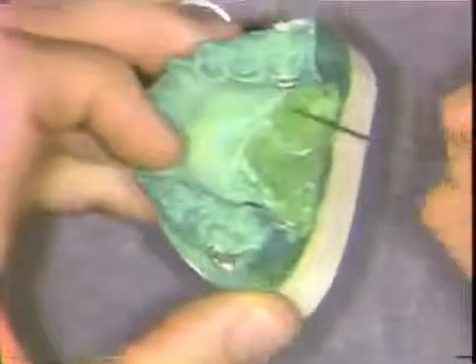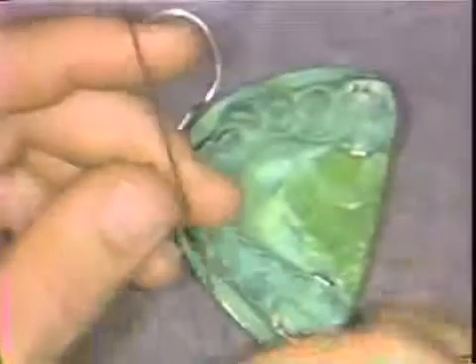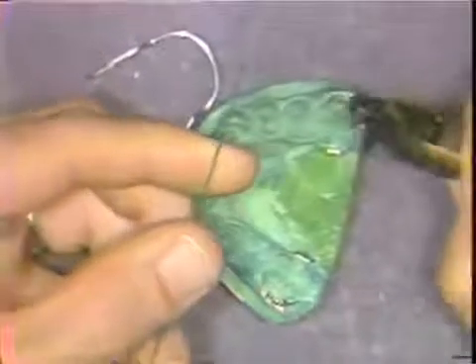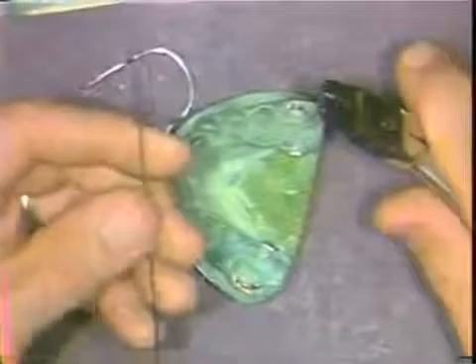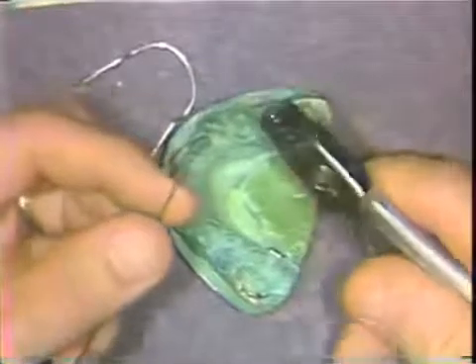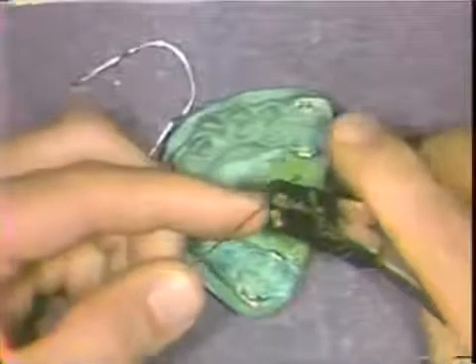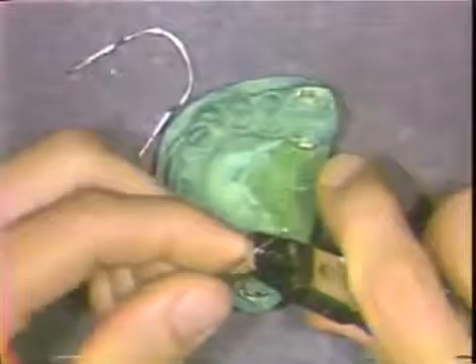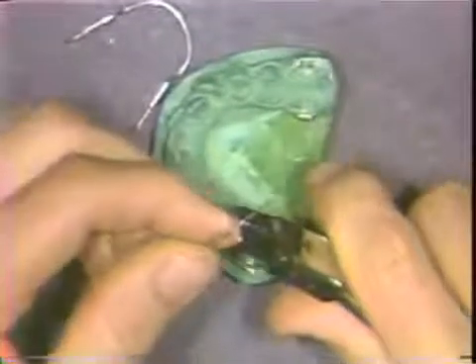The wax has been removed and the wire bending steps are now in order. A piece of 036 round wire and the lingual arch plier are the beginning instruments. About a half an inch down the length of the wire, the first right angle bend is made.